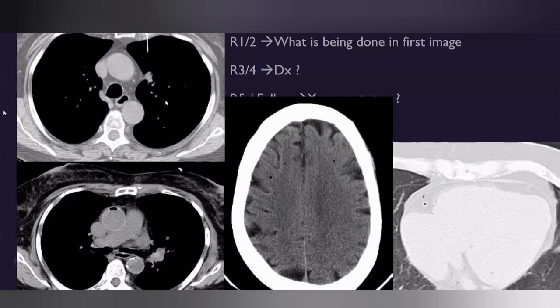So what happened in this biopsy is one of the side effects you must be aware of if you are doing biopsies. Nowadays we usually do core biopsies. Previously, back in the day, we used to do only fine needle aspiration. Now we all do 20 gauge coaxial biopsies. Pulmonary veins usually have negative or lower pressure than atmospheric pressure. So if the coaxial needle is left open, and you happen to traverse or are close to the pulmonary vein, then atmospheric air can go into the pulmonary vein, then into the left atrium, left ventricle, and into the aorta, and we guess where it will end up. It can end up in the brain, coronary arteries, or any vessel, even in the lower limb, but in the lying down position, it can even go to the carotid.